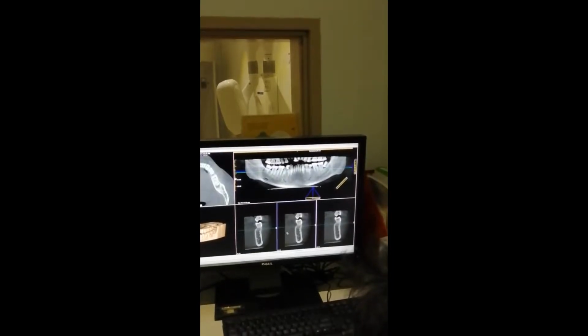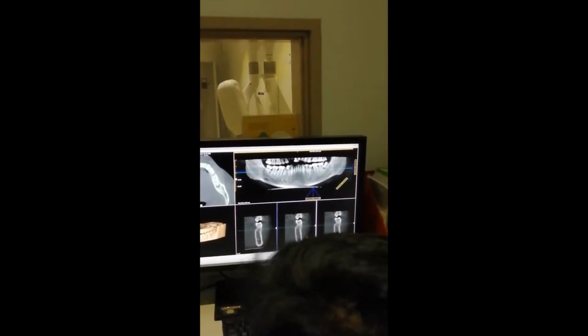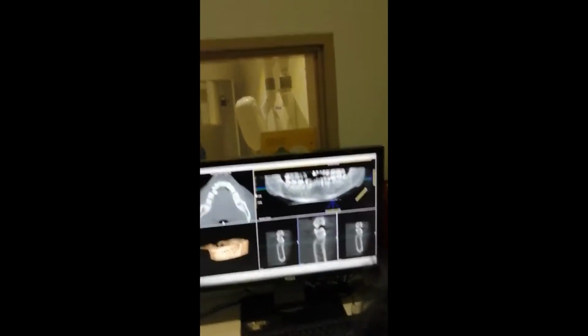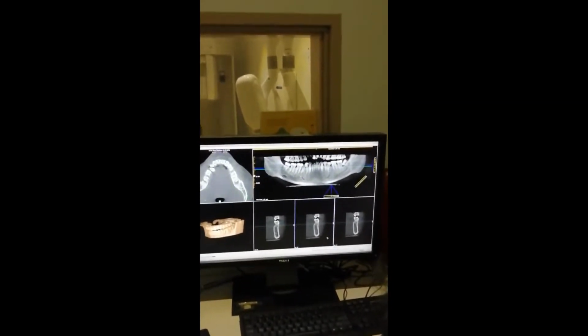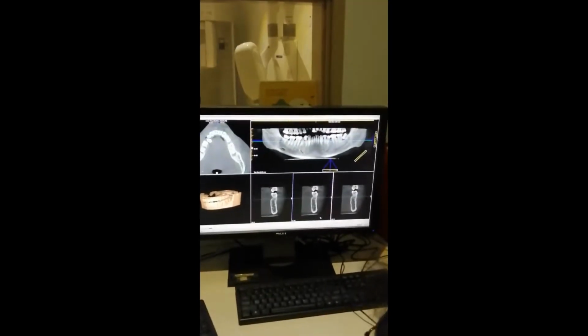Now, if I come further down, window level again. See, now there is a magnifying glass tool. Click to enlarge, click to decrease. So these are a few of the different tools.